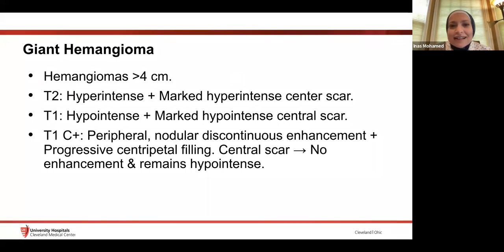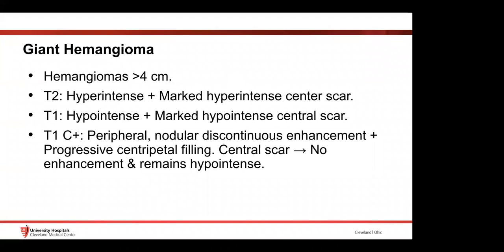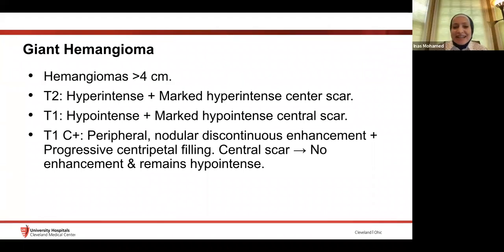Okay, yeah, go ahead. I think cholangiocarcinoma is the first possibility. Yes, cholangiocarcinoma, good answer. It is actually the scary cousin of hemangioma. Whenever you look at a hemangioma, it's not that high, like you think. It's a little bit T2 hyperintense. We call it the evil gray. It's not really that hyperintense on T2. And is this a hemangioma? If not a hemangioma, always put in the back of your mind cholangiocarcinoma, and we're going to talk about that later on.